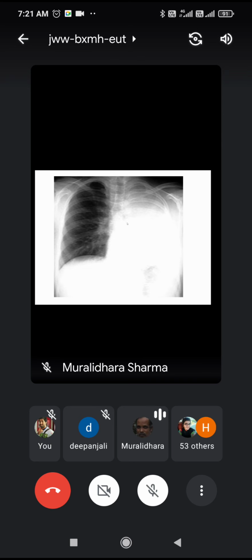In the other area, of course, the quality of the image as it is copied is not proper, but there is a consolidation-like feature, along with the reduction of the lung lobe size. The evidence of the reduction of lung lobe size is that the mediastinum is shifted. The air shadows are shifted to the left side. Virtually, you don't see these air shadows on the right side. That's typical of the atelectasis.